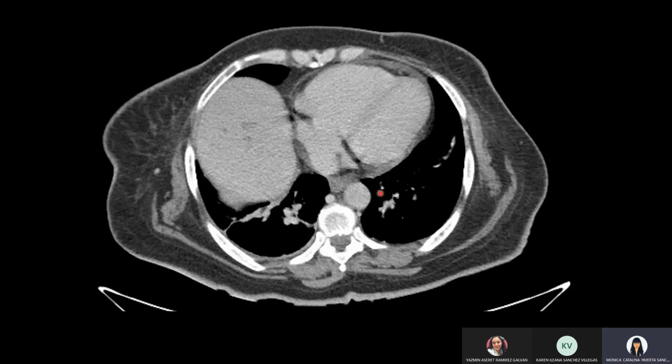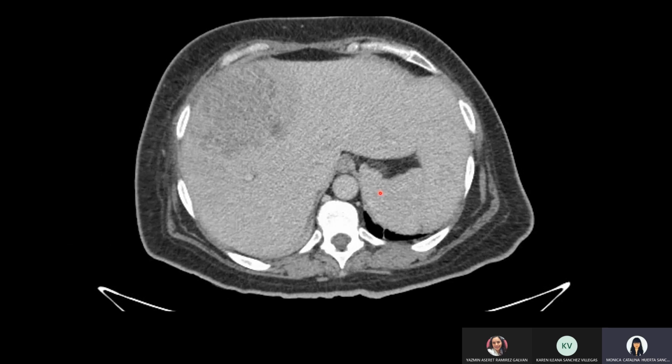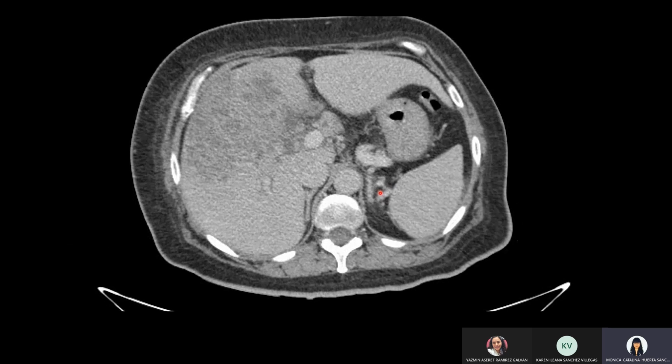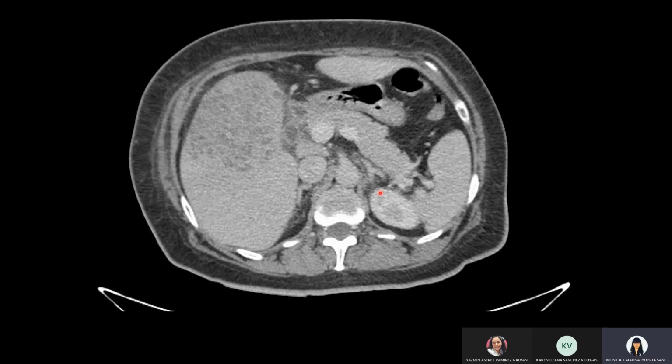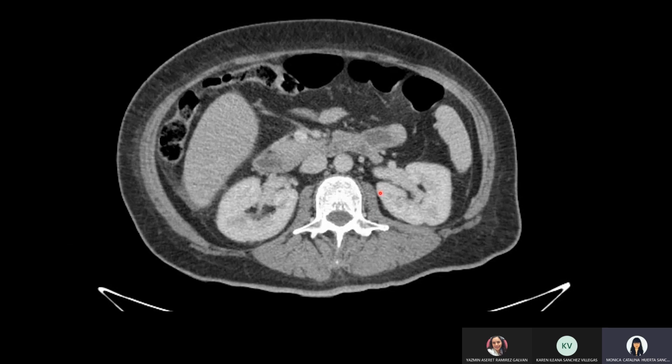And we have here a venous phase of the study, and we're looking at a soft tissue window. I'm going to let the study roll and address some of the findings real quick, and then we're going to focus on some of them.